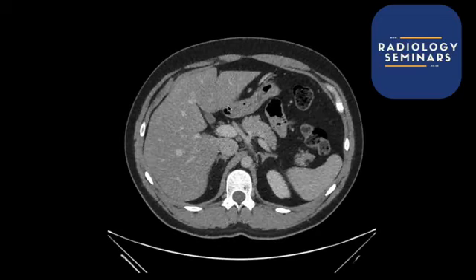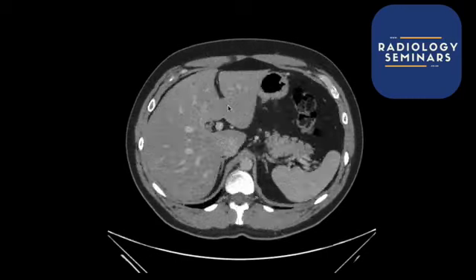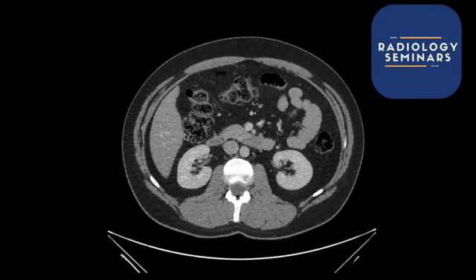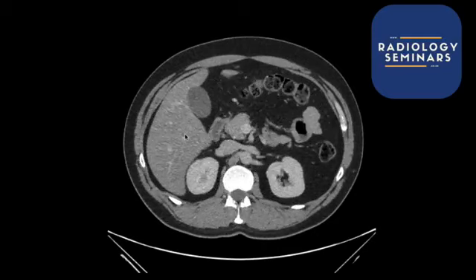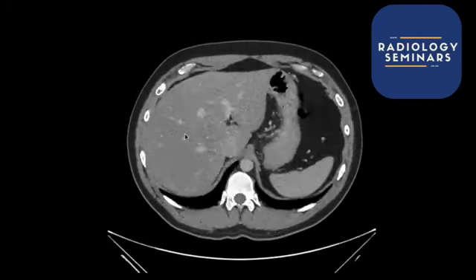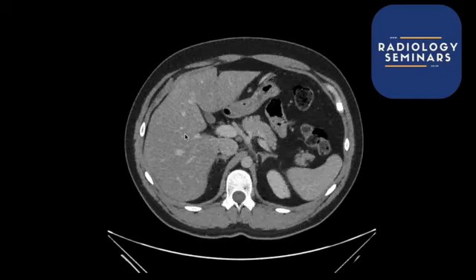4 is going to be in the region of the gallbladder, down, inferior is going to be 4B, superior is going to be 4A. Segment 6 is going to be that inferior tip over here. And once you've got that, you can figure out the rest. Where's number 5? Where is number 7? Where is number 8? So a bit rudimentary, I know, I'm sorry, but I think that is a quick way to try and figure out where you are.